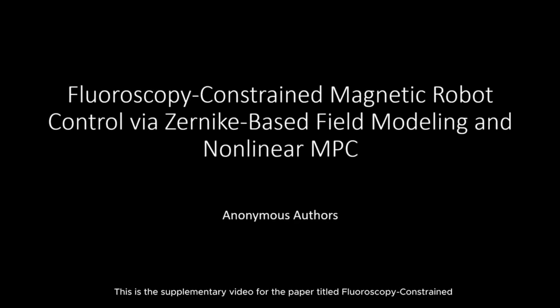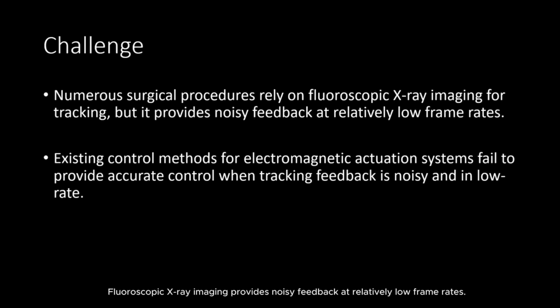This is the supplementary video for the paper titled Fluoroscopy-Constrained, Magnetic Robot Control via Zernike-Based Field Modeling and Nonlinear MPC. Fluoroscopic X-ray imaging provides noisy feedback at relatively low frame rates. Existing control methods for electromagnetic actuation systems fail to provide accurate control when tracking feedback is noisy and at a low rate. This study mainly focuses on addressing this challenge.